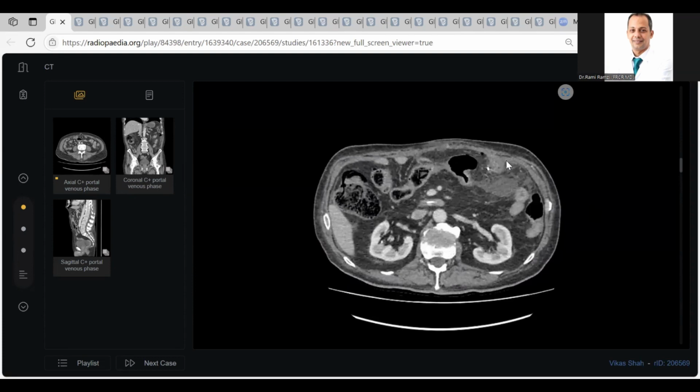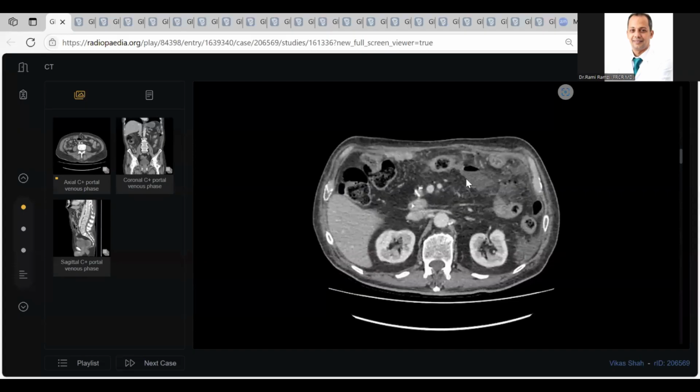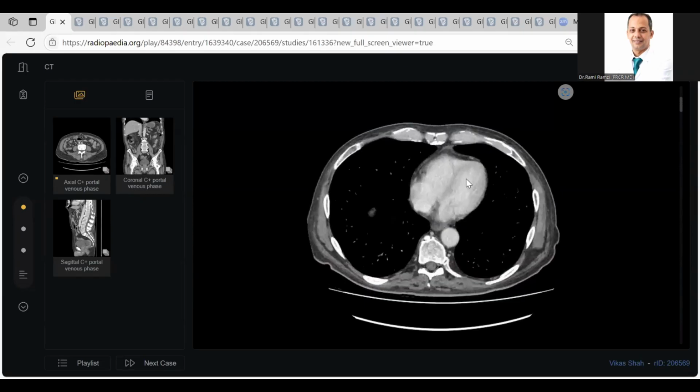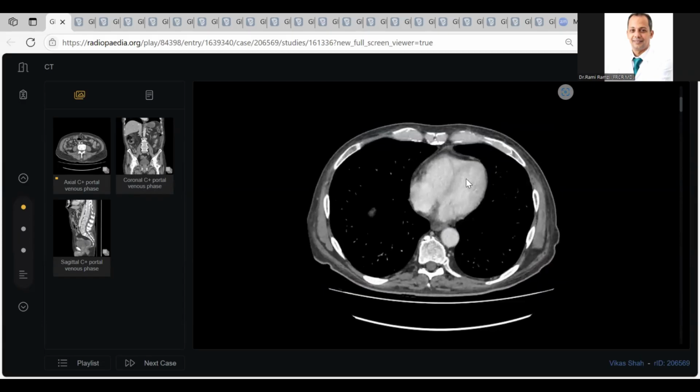Very nice. Oh, doctor, I find one clip. So connect what you're finding: fluid collection surrounding the site of operation plus pneumoperitoneum. See how many pockets of gas? So, doctor, this is almost leakage. Like this, you will finish the case very smoothly. Then you can ask the examiner, I will change to lung window, and the management I will call. All of this is appreciated, but not appreciated before giving me a good logical diagnosis.